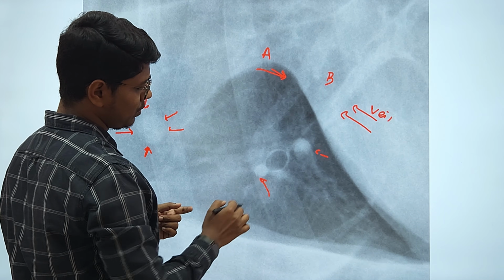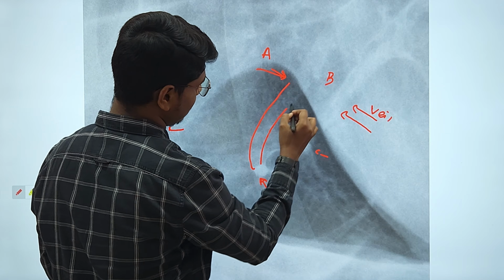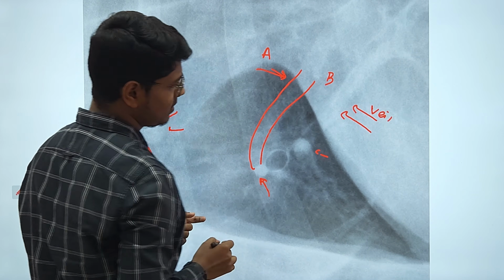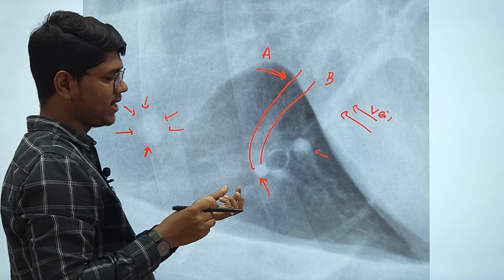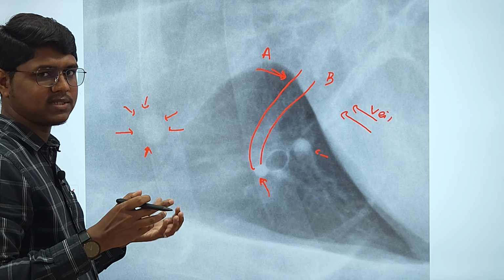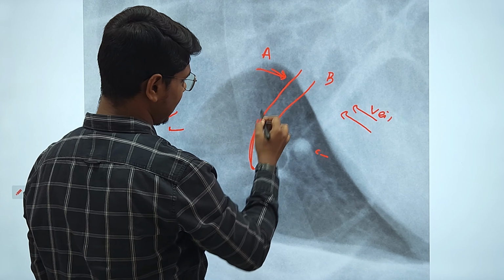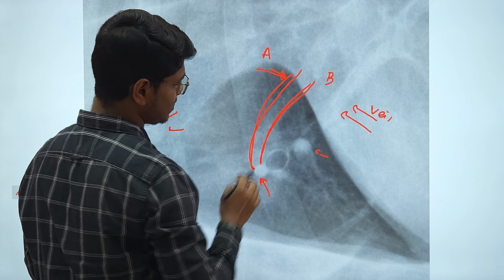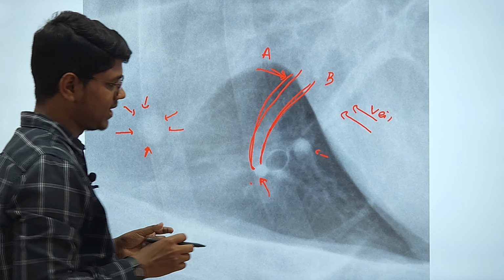I told you, when you find a nodule with a tail, you can see there is a tail. It is basically the elongation of the vessel. So it is not a pathological nodule, it's simply the end on striking, the X-ray beam has struck the vessel end on. Okay, so can you differentiate diagnosis between a nodule and the end on vessel?